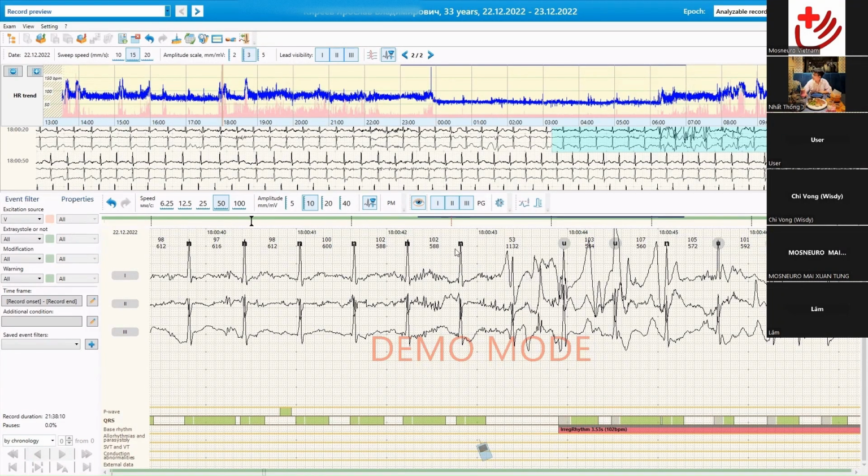The software calculates the rhythm according to the surrounding complexes. And in this case, the complex exists, but it's noisy. So if I don't want it to influence some calculations, I can use not the normal notation, but the U notation. That means this complex is undefined, unspecified.